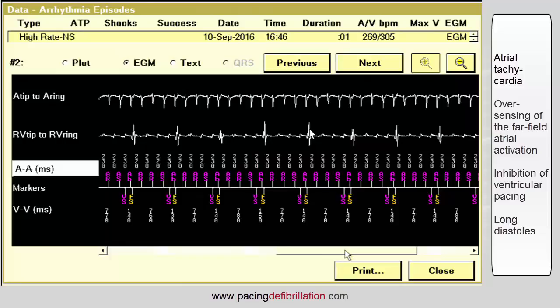After a ventricular sense event, the ventricular sensitivity threshold increases to 75% of the EGM peak, and then the sensitivity increases all along the cardiac cycle. This explains why these ones are not sensed and this one is sensed. This alternance between these two cycles, short, long, short, long, short, long, explains the typical aspect of railroad track.